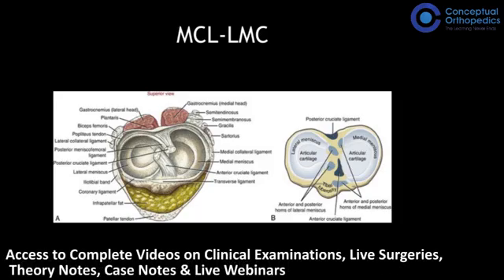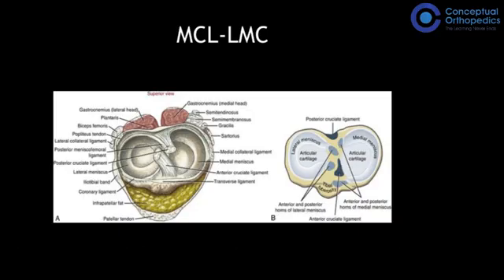As a student, sometimes on an X-ray, they can show you the tibial spine or the intercondylar area on the upper end of the tibia and ask what structures go from anterior to posterior. So it's a good idea to remember it's the anterior horn of the medial meniscus number 1, behind that the ACL, then the anterior horn of the lateral meniscus, then the posterior horn of the lateral meniscus, the posterior horn of the medial meniscus, and as I just told you, the most posterior element is the posterior cruciate ligament.